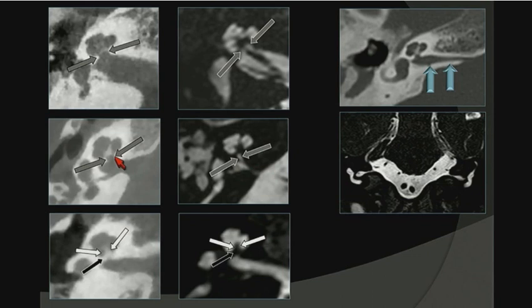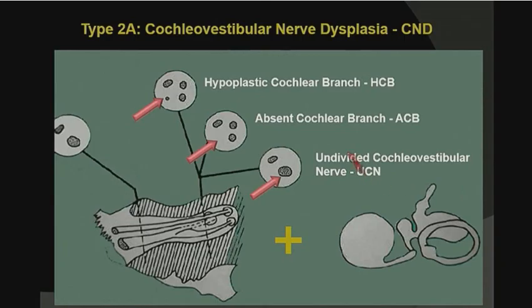So you cannot rely on your CT scan. You have to do the MR to know that. And I give you another example. I have an opening, I have a modiolus, I have a narrowed internal auditory canal, and on both sides there's an absent 8 nerve. So no implantation possible. So you always have to check on MRI before you really know if there is a nerve or not.